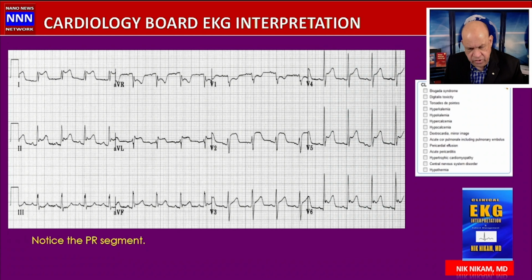No, you don't do that. So we need to know whether what we are dealing with is normal variation, or is this abnormal? This is abnormal. Somebody with a fever, little aches and pains. Now, diffuse ST elevation, a young person, you think about pericarditis.